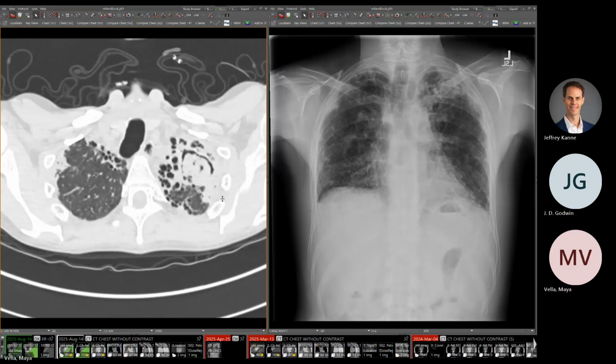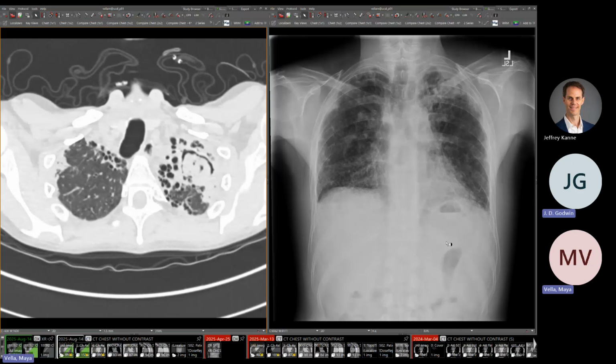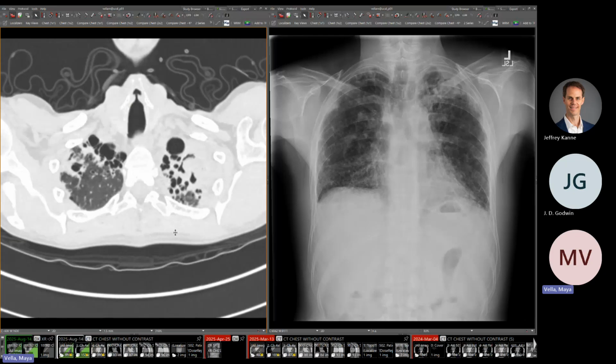Makes sense. But evidently, according to the latest Fleischner guidelines, they're calling this air crescent sign now. They've given up. And I think that's an important distinction that is therefore being lost. I'm going to resist. Yeah, agreed.